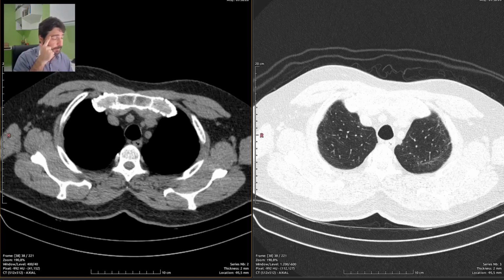So let's just make it short at the end of the report so the doctor can read it faster and be happy about it. I just summarized the entire report in a few sentences so the doctor can go through it much faster, and if he is interested, he can go up and read the actual text of the report, the longer description.